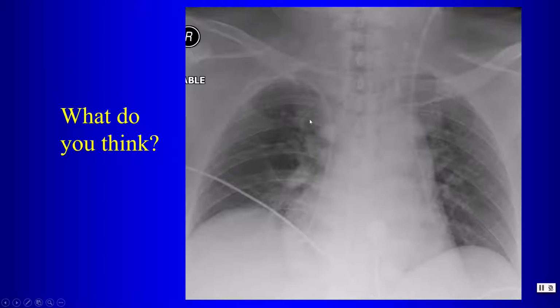Here on our next case, we have a patient with two central venous catheters. The first one here has the tip overlying the right atrium. The second one, though, comes down the left side of the mediastinum. So the question is, where is that going? Whenever you have a catheter that looks like it might be taking an abnormal course, the first thing you want to do is check to make sure there is blood return, to make sure that it is intravascular, and this catheter was intravascular.